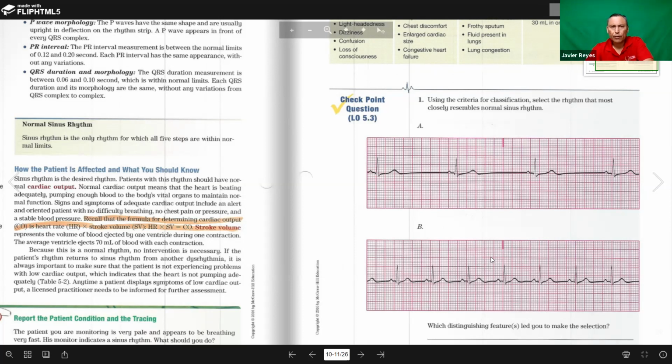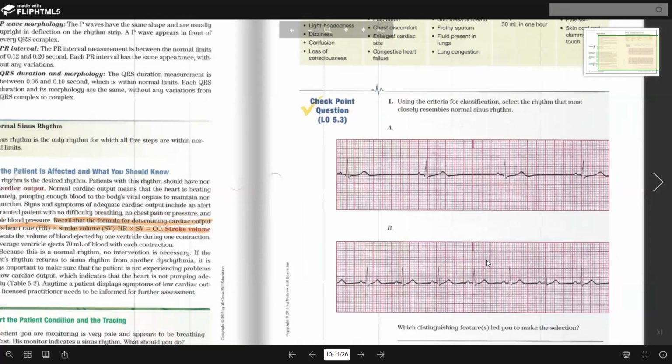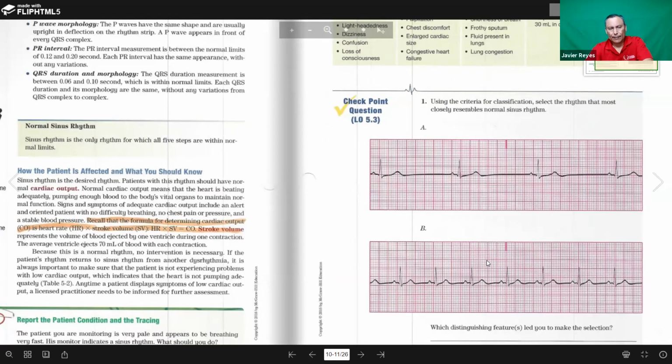I think we did that earlier. 79. About 79, exactly. Did you already calculate, Jenny? Sure, I was going to ask a question for the 300 method. The boxes have to be complete. Yes, they have to be complete. That's why it's not very accurate.